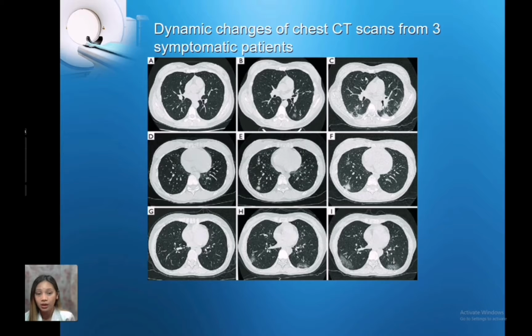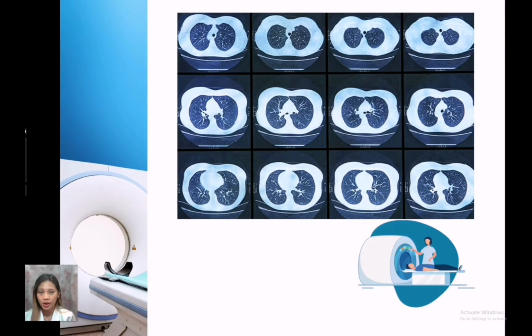If the patient is normal, the appearance of the lungs should be totally black. So you won't see any ground glass opacity. Unlike a patient with a disease, where you see patterns or signs that may indicate a particular disease. Much better the moment a patient feels something. If they feel something off in the body, they should undergo a CT scan, or otherwise they can have a chest x-ray first. So that would be all.